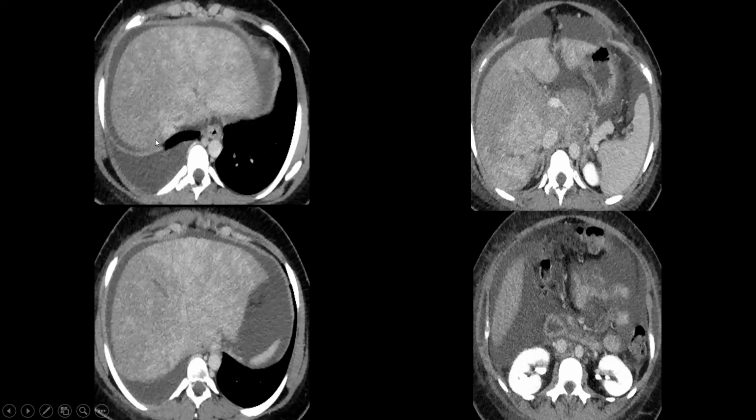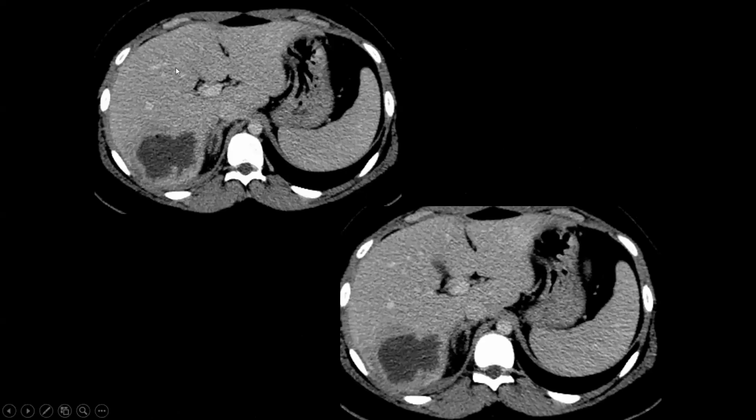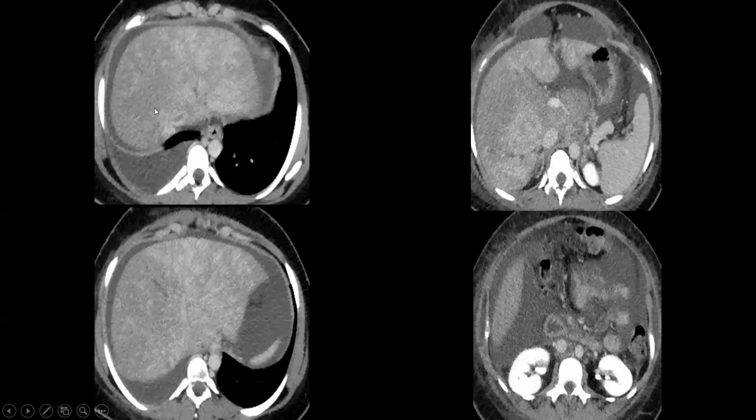And you can see the enhancement of the liver, instead of being homogeneous, like in this case, where you can see homogeneous enhancement of the liver, the liver is actually quite heterogeneous in enhancement. This usually indicates congestion or inflammation of the liver. So thrombosed hepatic veins, congested heterogeneous liver, and you can see there's also ascites in the upper abdomen. This was diagnosed as Budd-Chiari syndrome. This can also be diagnosed by ultrasound and can be assessed also by CT scan or MRI.